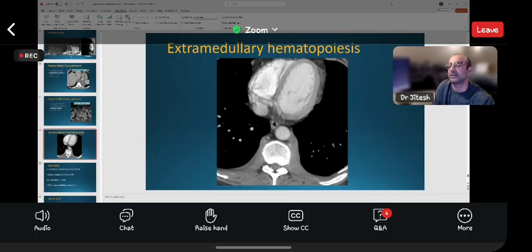So based on other imaging patterns, the presence of gradual narrowing or occlusion of the vascular structures and airway structures, their overall morphology is very ill-defined. They can look mass-like, but they are usually very spiculated lesions. And then the presence of other granulomatous lymph nodes. So those can be helpful in differentiating, definitely.